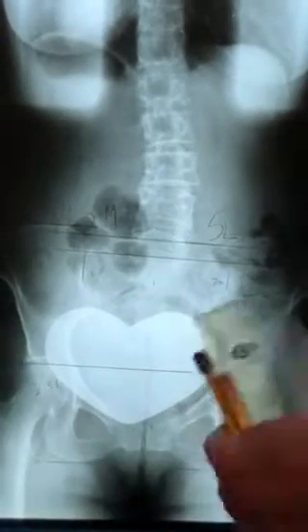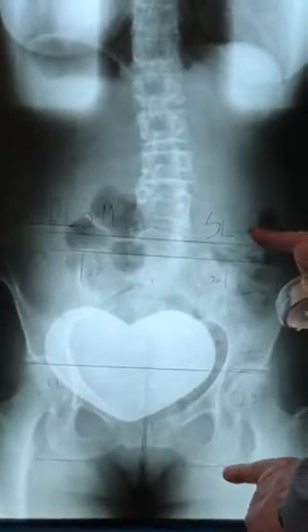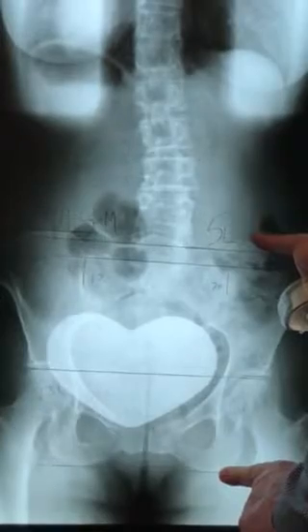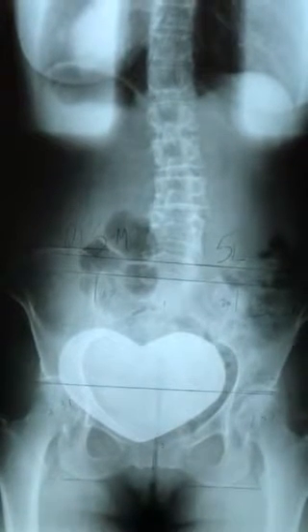Next, you're not going to have a pencil, but we will give you the parallel. We'll have all the lines drawn on the X-ray, and we're going to ask you to measure from the top of the ilium to the bottom of the ischium. That's the height or the length of the ilium on the right side and the length of the ilium on the left side. In this patient, you line the parallel up like this, and it measures 233 on the right. On the left side, it measures 231. So we know the longer side would be the PI side, so the answer is a PI on the right. Of course technically it's a PI2, whatever the difference in number is, but just know it's a PI on the right.